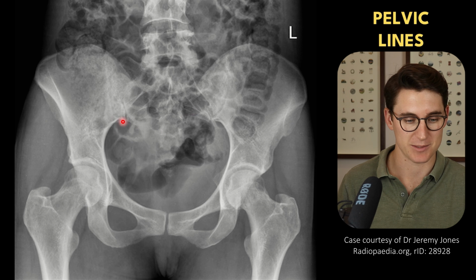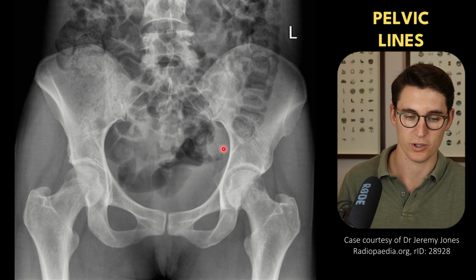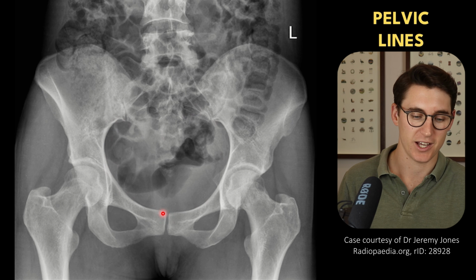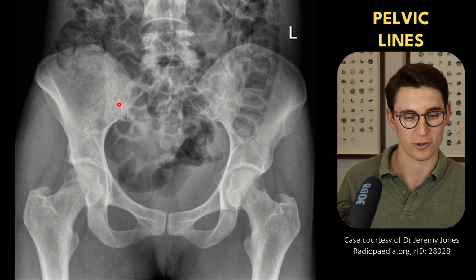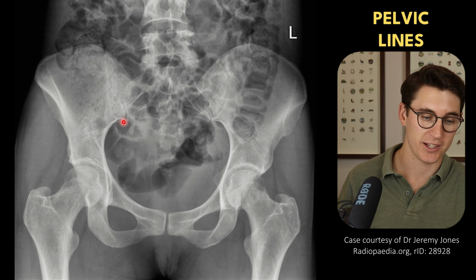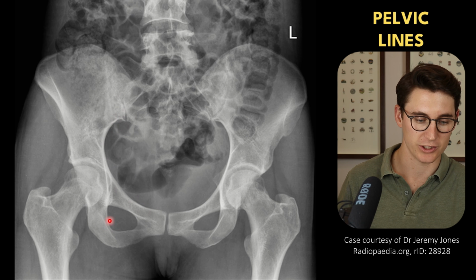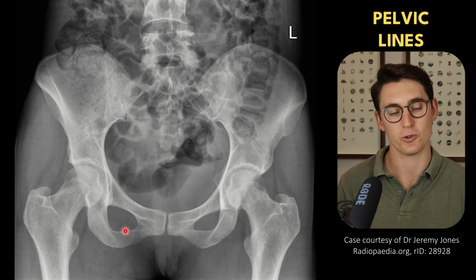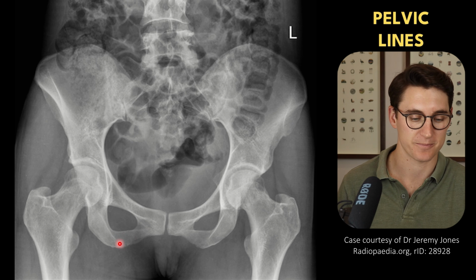So the first line is this main pelvic ring that I've shown you before, and the first half of that main pelvic ring is known as our iliopectineal line. I told you here's our pectineal line, so we go from the ilium to our pectineal line is our iliopectineal line. It must be nice and smooth there. We can then draw a line inferiorly called our ilioischial line, and this line up here must be nice and smooth as well, our ilioischial line. That ilioischial line comes on the medial surface of the ischium here and then heads up to the superior surface of that inferior pubic ramus.